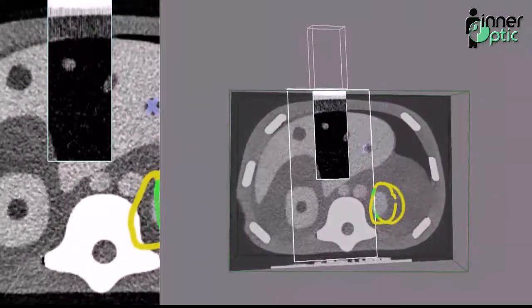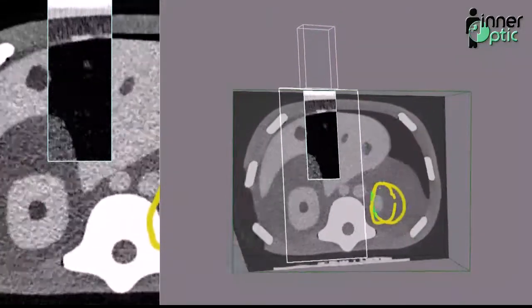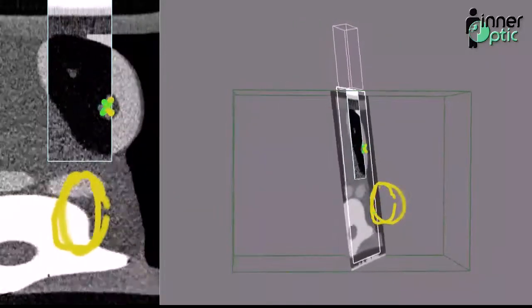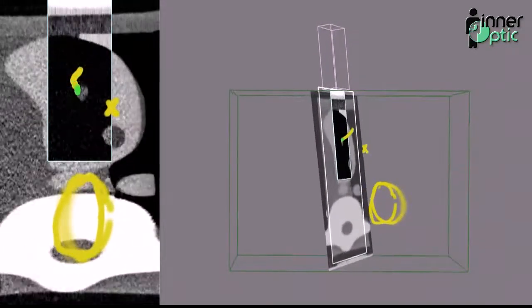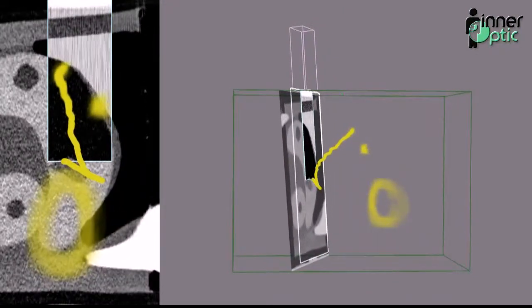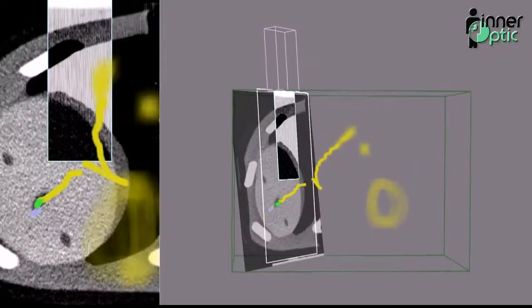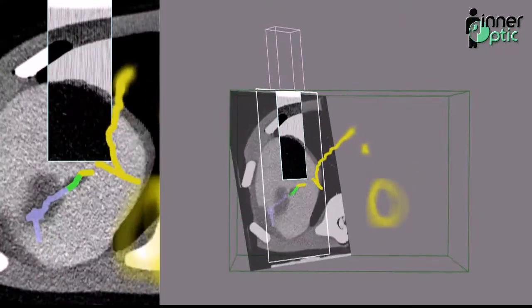And we can also even annotate structures that don't fit into a single 2D plane. So for example, there's 3 blood vessels in this liver phantom, and by simultaneously moving the ultrasound probe and following it with my finger, I can trace these structures. Again, it's informal and approximate, and because it's informal, I'm going to give myself a reminder by drawing an arrow to come back and look at this more closely.